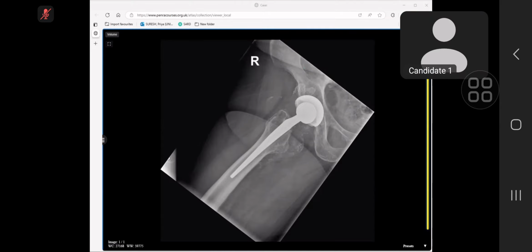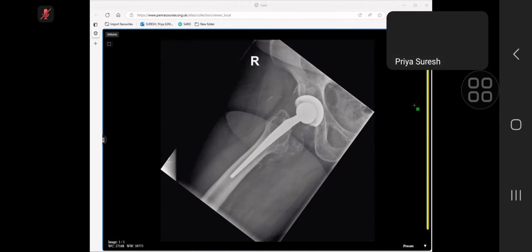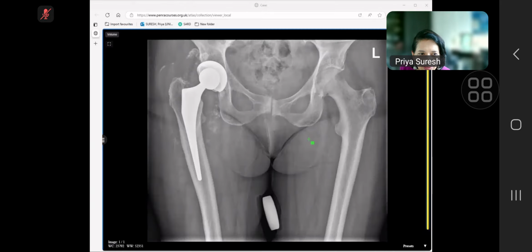Yes, I should ask. Okay, so what do you want to look at previous, and why do you want to look? So now, no Viva pressure. You said heterotopic calcification, but I agree with you, it doesn't look like this at all. I'm glad that you dismissed it, because it should be around the greater trochanter or where the insertions are, or in some places, but not like this, round, like a shell around it. So we don't like that.